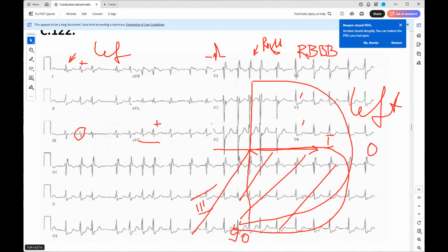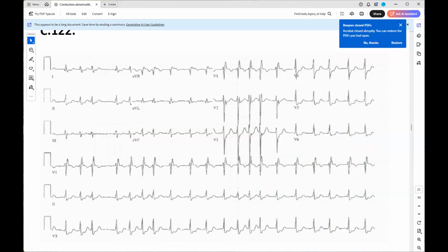Lead number 3 is perpendicular to 30. And lead number 3, this is what I said, it's almost 0, yes? Positivity and negativity are about the same. This is why I said this should be 0. Okay? All right. Good. Let's see.